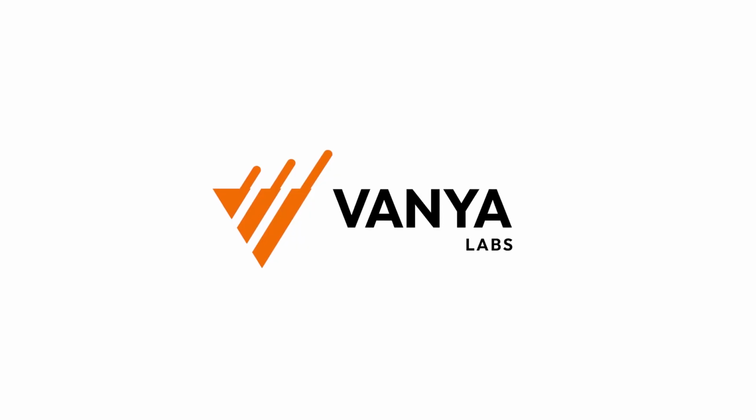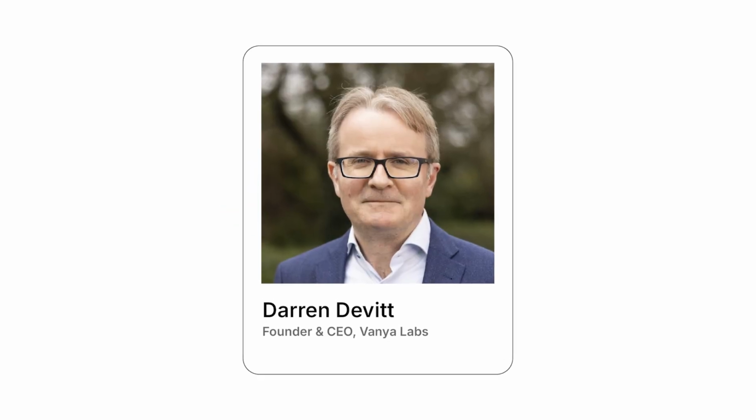In this lesson, I want to give you a practical look at FHIR in the wild, and specifically we'll be looking at the Vanya FHIR Viewer, an app built by Darren Devitt, and we'll just compile all of our lessons that we learned and see what this actually looks like in the real world.